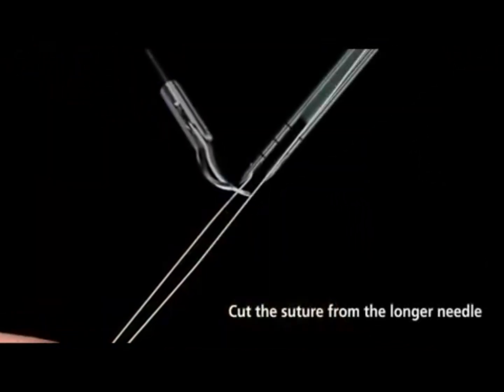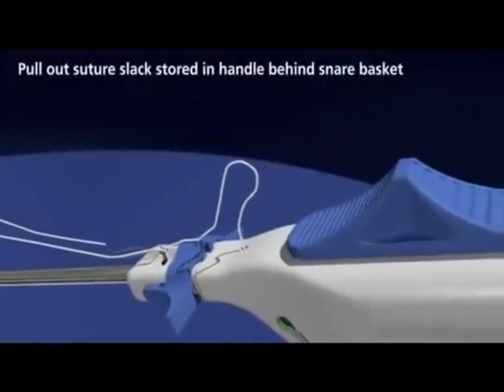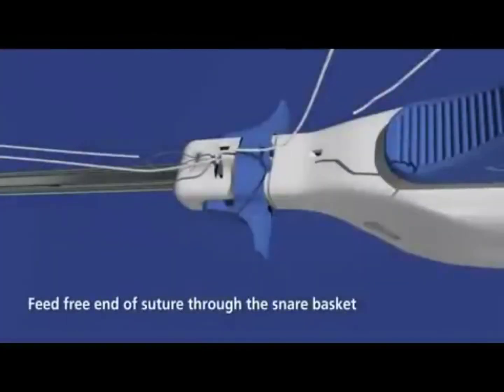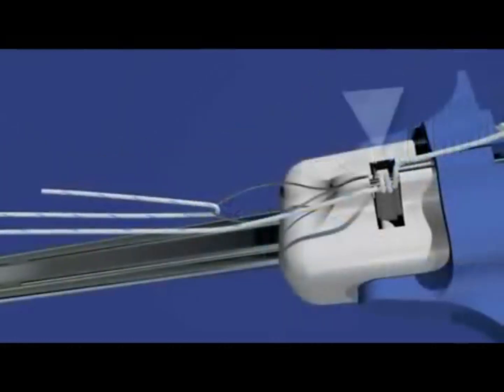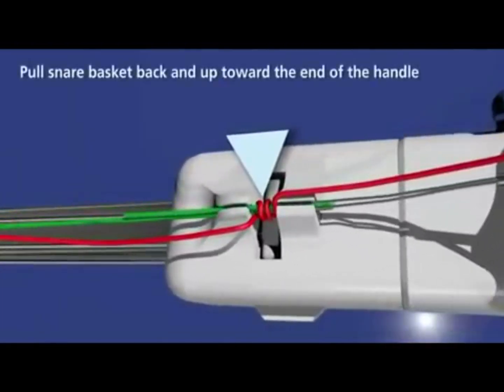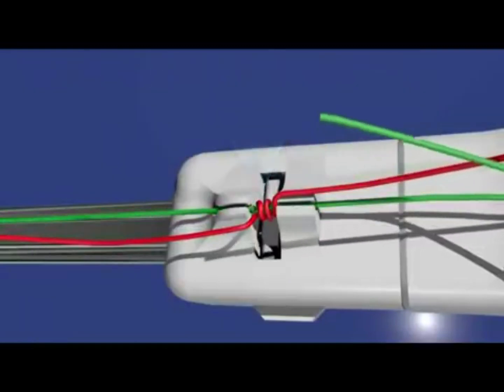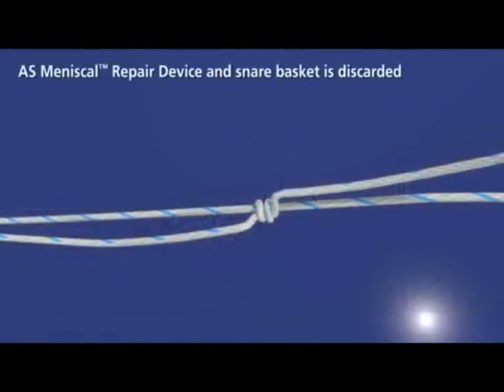Cut the free end of the suture from the long needle. Pull out suture slack stored in the handle behind the snare basket. Feed the free end of the suture about 2 to 3 inches into the snare basket located on the distal end of the handle. Place your free hand's thumb over the top of the pre-tied knot, holding it in place. Pull the snare basket back and up towards the end of the handle to thread the suture through the pre-tied knot. Discard the AS meniscal repair device and snare basket.